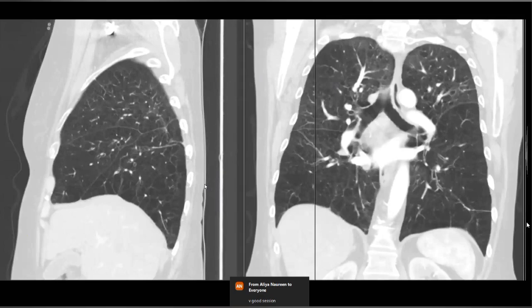So here is the characteristic difference between emphysema and cysts. Emphysema does not have walls. You can see vessels going across it. Cysts have definable walls. Both of them on X-ray would look the same. You would have reticulations with increased volumes. You can differentiate them on CT scan. And when you have lower lobe emphysema, think about alpha-1 antitrypsin deficiency.